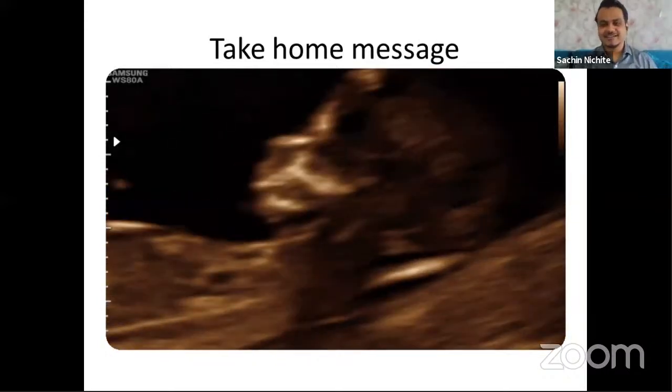He's angry. He's angry because so many years after Kypros has revolutionized NT, still these things have to be taught to everybody. We don't know why. The fetus is also angry because there are such clear-cut guidelines that NT has to be taken like this. Every day we have to teach like this. Our teachers are taking so many efforts, but still the NT is taken day in day out like that only. The reason we don't know.